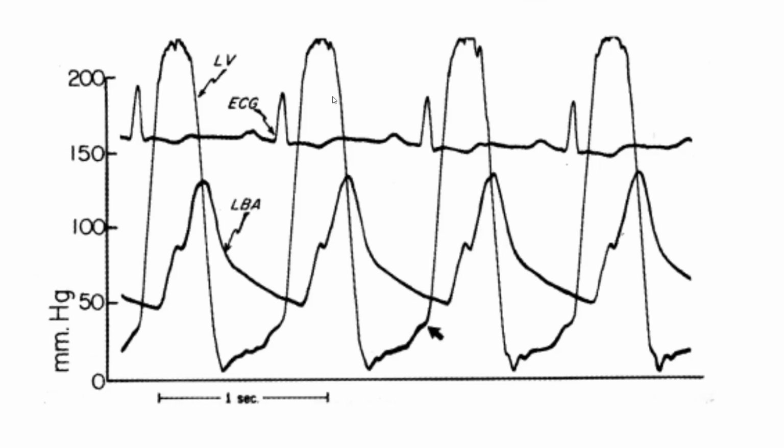So the diagnosis now: is AS severe? Like I explained, AI exaggerates the AS gradient. However, this gradient is way too excessive to call it moderate AS. Also, keep in mind that we're using the brachial artery, and we have AI, so the aortic pressure is significantly lower. So your gradient between LV and aorta is really very high. So this patient truly had a combination of severe AS and severe AI.